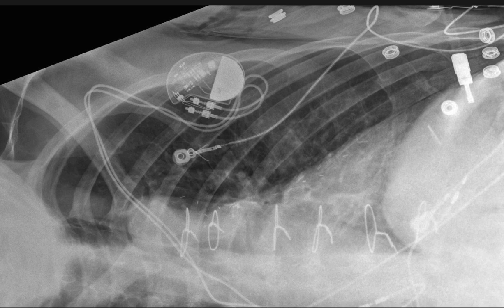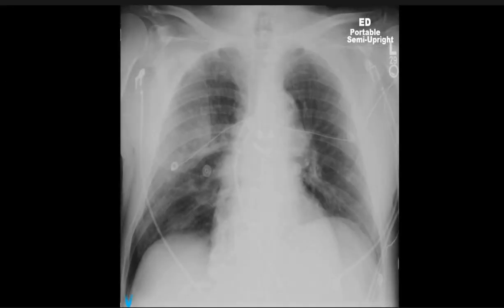It's not real. Another case here: notice we've got a deep sulcus on that side relative to the other one. So we're worried that this patient has maybe got himself a pneumothorax. Notice that this film is labeled semi-upright. Remember that I said in prior lectures that semi-upright should be treated essentially as supine, because they could be just 5 degrees elevated and still be labeled semi-upright.